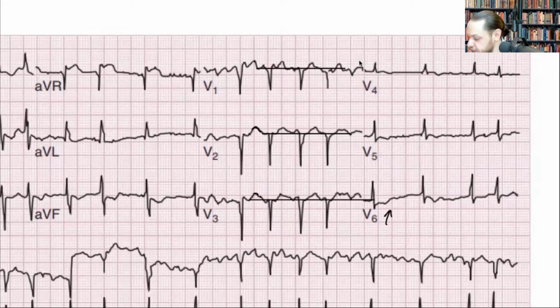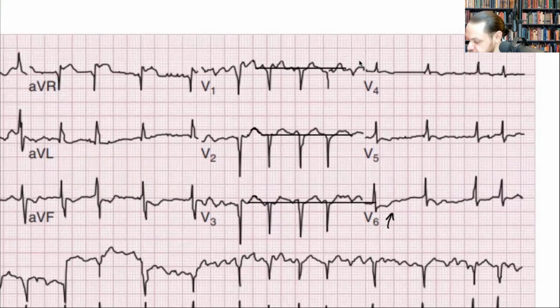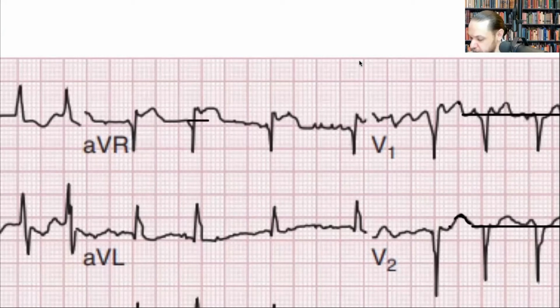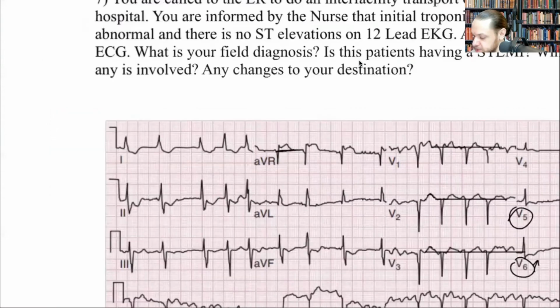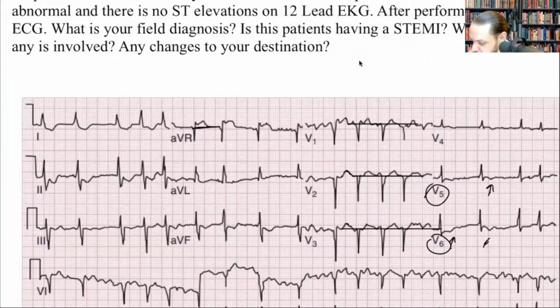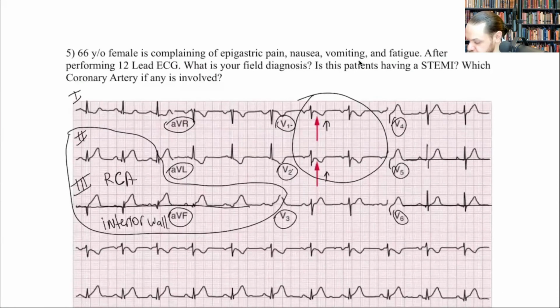You could say your V5 and V6 leads here do have some T-wave inversions, but you know where I see elevations? AVR. Yeah. That's a lead most providers don't look at because it's not really contiguous with anything. But the problem with this is this, right? Let me show you, first of all, how, let me do that. I'll copy it like this. So let me go back to how AVR should look. So look, you see how AVR is here?